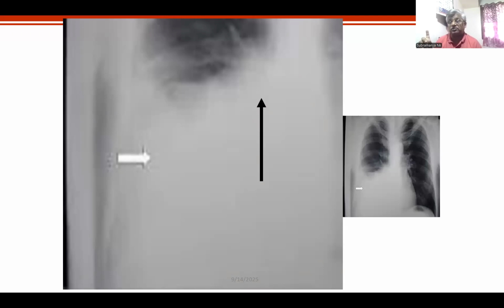A good test is ultrasound. But when you take an X-ray, the fluid collects behind the liver, in the recess or in the pocket. You understand? This lucency is lost. From today, don't tell me, sir, I couldn't diagnose effusion. This applies to both left side and right side.